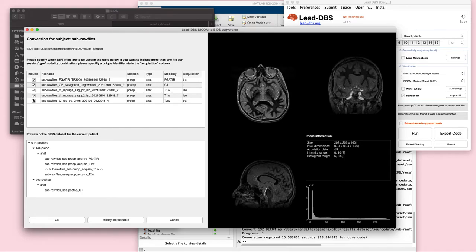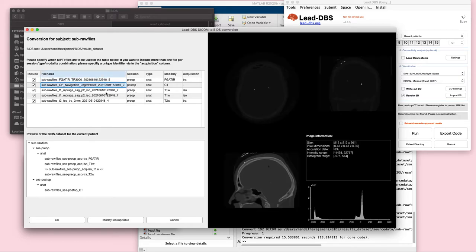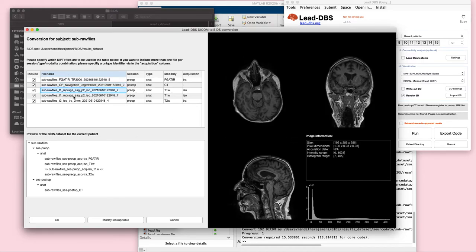On the left panel, you can see that there is information about the files, and on the right panel is a 3D viewer that gives you images of the particular file. If you want to see how another file looks, for example, this is the post-op CT file, you can just do that by clicking on that particular file. The bottom panel here shows how the BIDS dataset will eventually look.